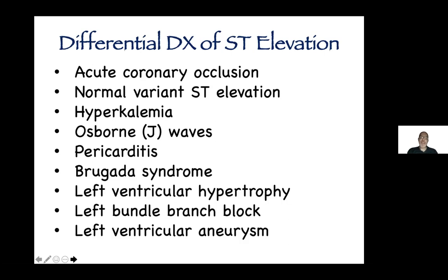Now, hyperkalemia, if you follow Dr. Amal Mattu at EKG Weekly, he calls hyperkalemia the syphilis of EKGs, the great imitator, because one, it always shows up when you don't want it to, and it can virtually mimic any cardiac dysrhythmia, narrow, wide, slow, fast, with or without AV heart block.